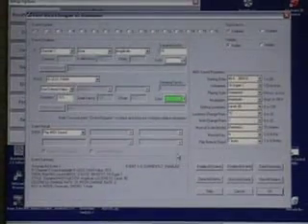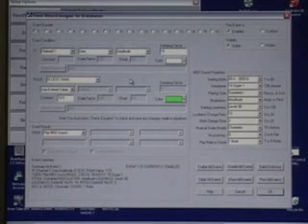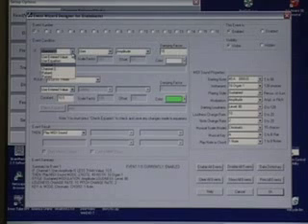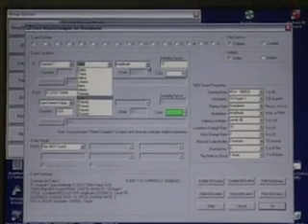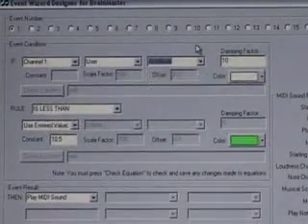Tom, what is the Event Wizard? This is a new, very flexible and simple to use interface that allows you to design everything from simple to complex protocols. The programming interface uses pull-down menus and English language choices, allowing you to build protocols the way you think about them without the need to do special designs.